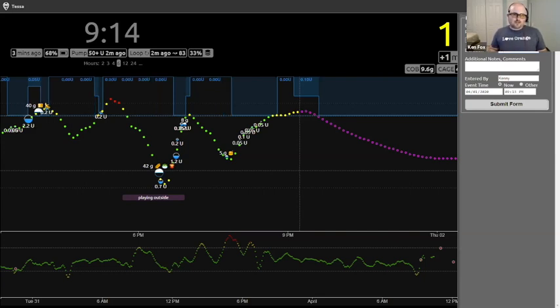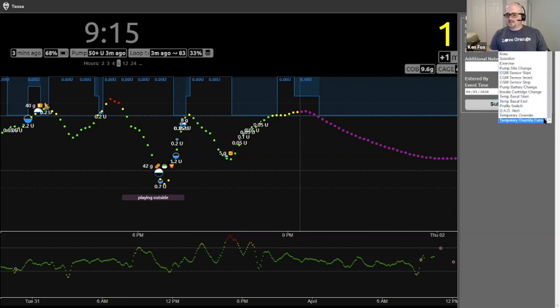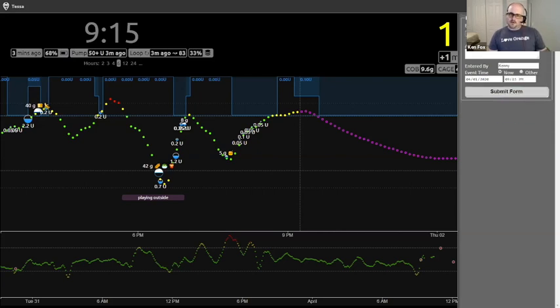But you don't want to forget to turn it off later, especially if they're going to do another carb entry. You don't want to have a really high carb ratio. You can just turn it on for 20 or 30 minutes or something, and it'll time out on its own. And then cancel is just what it sounds like. It just cancels whatever override's running for whatever reason.